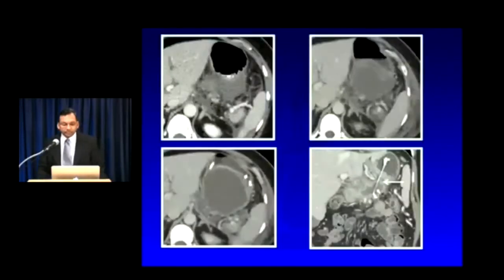get there. So here's a nice chart that really illustrates the evolution of an acute peripancreatic fluid collection into a pseudocyst. Notice that initially the collection in the upper left is conforming to the shape of the retroperitoneum. It's non-loculated, but over time it becomes loculated with a well-defined enhancing wall and starts exerting mass effect on the stomach. And you can see in the last image on the bottom right, they've put in a cystgastrostomy.